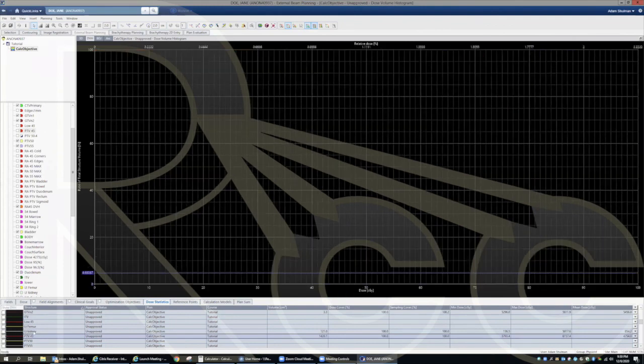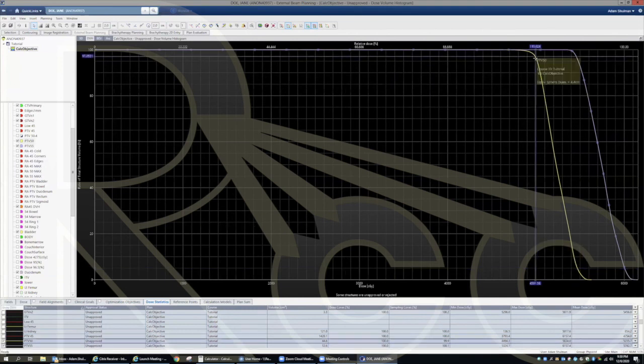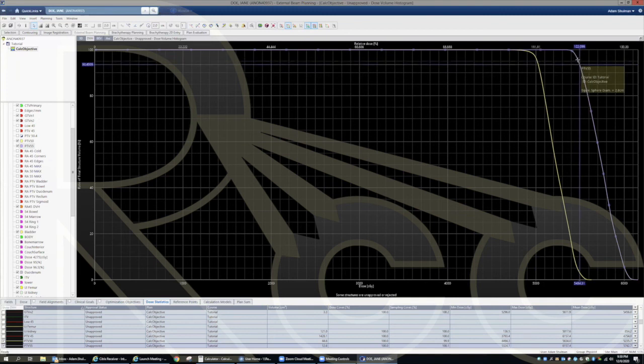We have to look at our DVH. PTV-50. Here's 50 to 55. See if I got it. Yep, 96.5% coverage for this one. PTV-55. I think I just missed PTV-55 at 93% coverage, but you can see how close. 95% coverage is 23 centigray low.